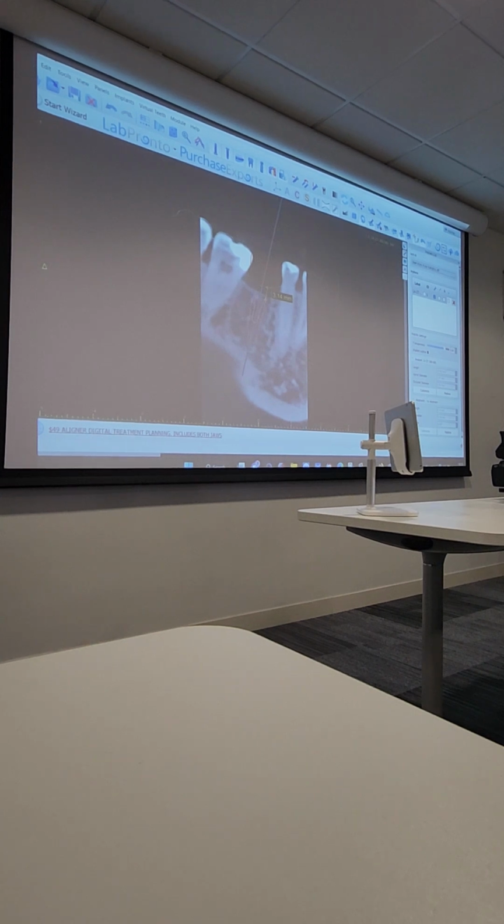Just a quick question. On the drop down menu, I didn't see MegaGen. Will it only do strictly guided? It should. I know MegaGen has, right? You mean here, when you first put them in? That's where you go first, yeah. It didn't show MegaGen because I had a look the other night. Oh, really? That's strange. It didn't look like they're only guided kits.